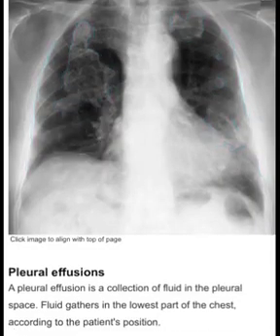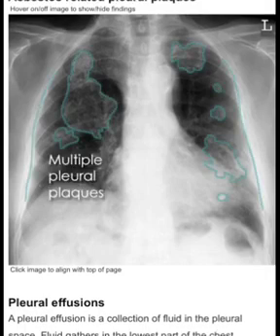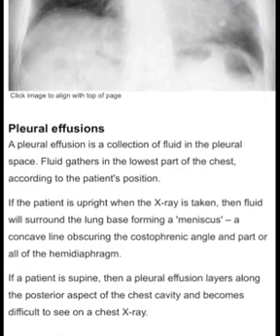Asbestos-related pleural plaques, bilateral well-defined irregular shadows that are as dense as bones, peripheral pleural thickening. Clinical information: chronic mild shortness of breath, retired dock worker with history of multiple exposure to asbestos. Diagnosis: bilateral calcified asbestos-related pleural plaques.